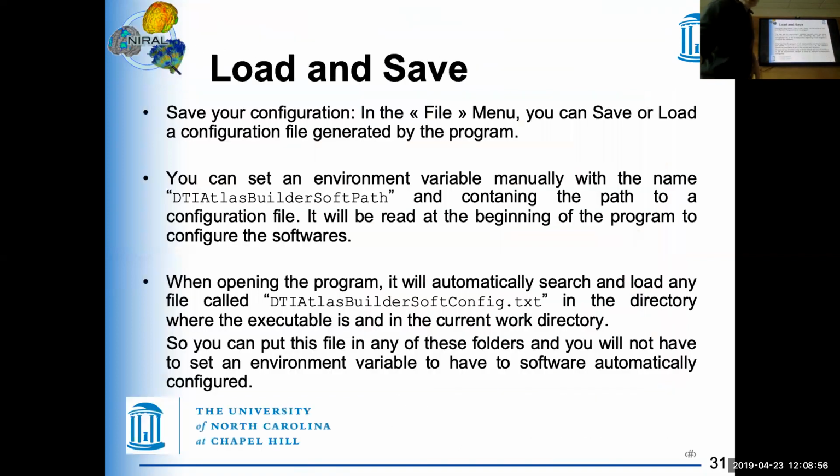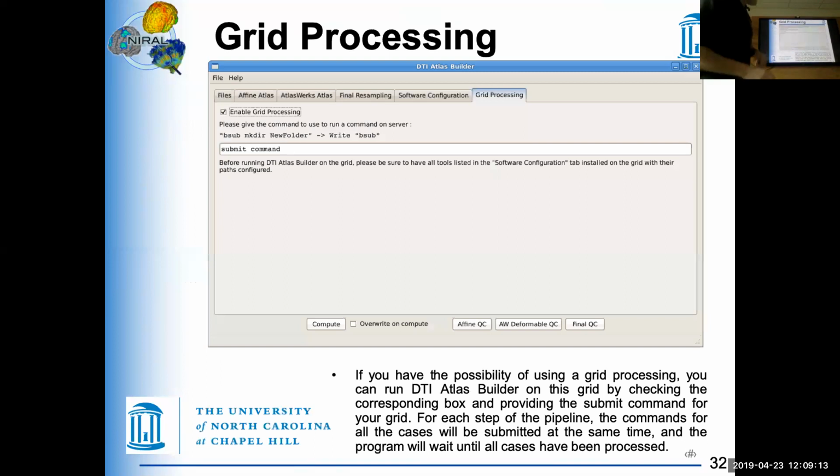Okay, I'm going to skip this. And you can load and save that separately, so that if you have a certain system set up and you want to build multiple atlases, you can save this once and then use it for all the atlases that you build. And it even has support for grid processing. Now, the default is made for Kill Devil, because that's when we developed this tool. As you know, those of you who are now on Longleaf, Kill Devil and Longleaf are quite different. So you would have to write in here your submit command.